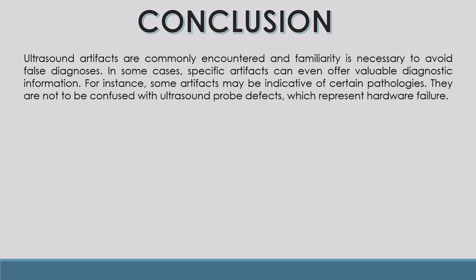So, we conclude that ultrasound artifacts are commonly encountered and familiarity is necessary to avoid false diagnosis. In some cases, specific artifacts can even offer valuable diagnostic information. For instance, some artifacts may be indicative of certain pathologies. They are not to be confused with the ultrasound probe defects, which represent hardware failure.